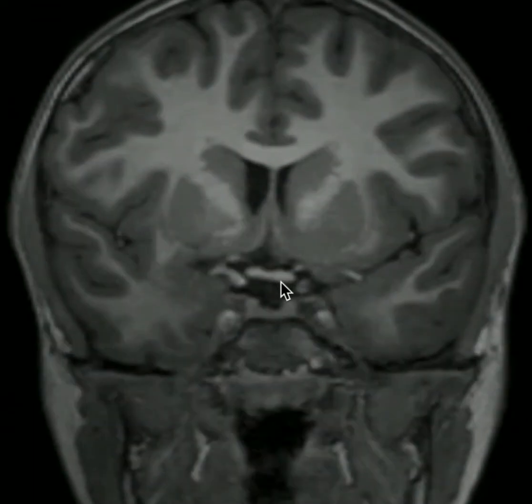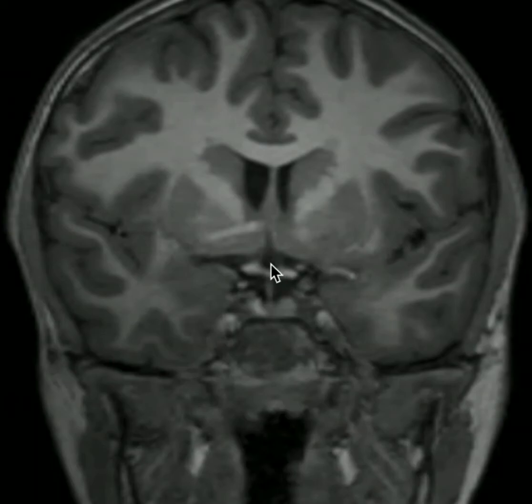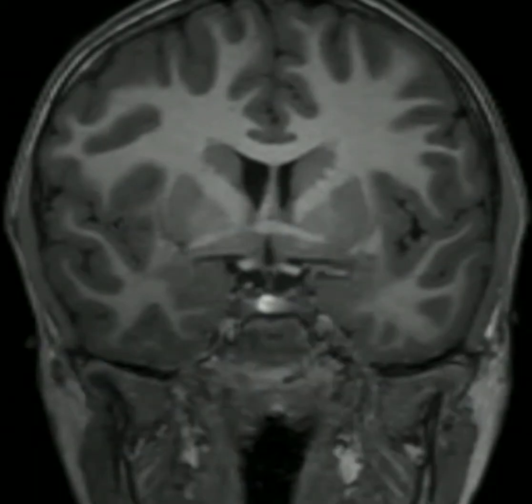If I go a little further posteriorly, we'll see the supraoptic recess of the floor of the third ventricle, also known as the chiasmatic recess, and further posteriorly, we'll see the infundibular recess right here. Also at this point, we're seeing the posterior pituitary. We know it's the posterior pituitary because of the intense signal here, indicative of the presence of vasopressin. Also on this slice, we're seeing the optic tracts here and here, now diverging away from each other as I course further posteriorly.